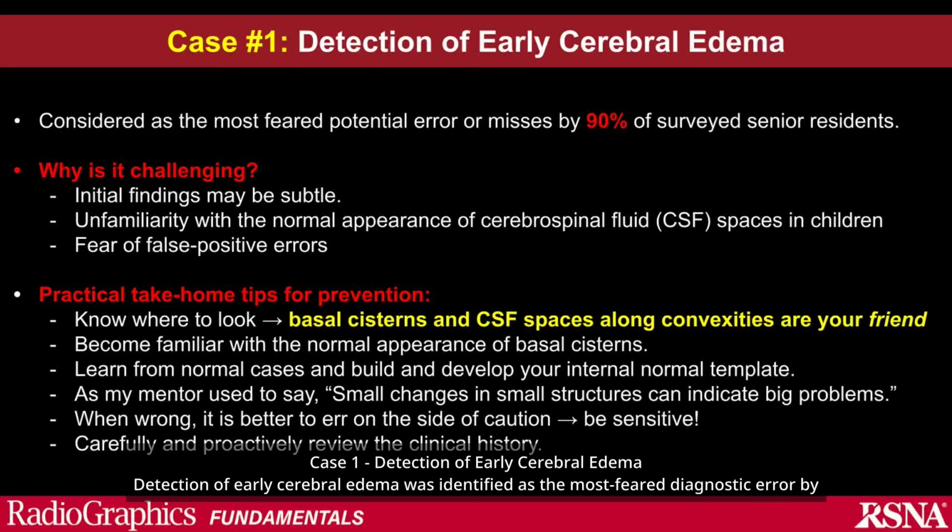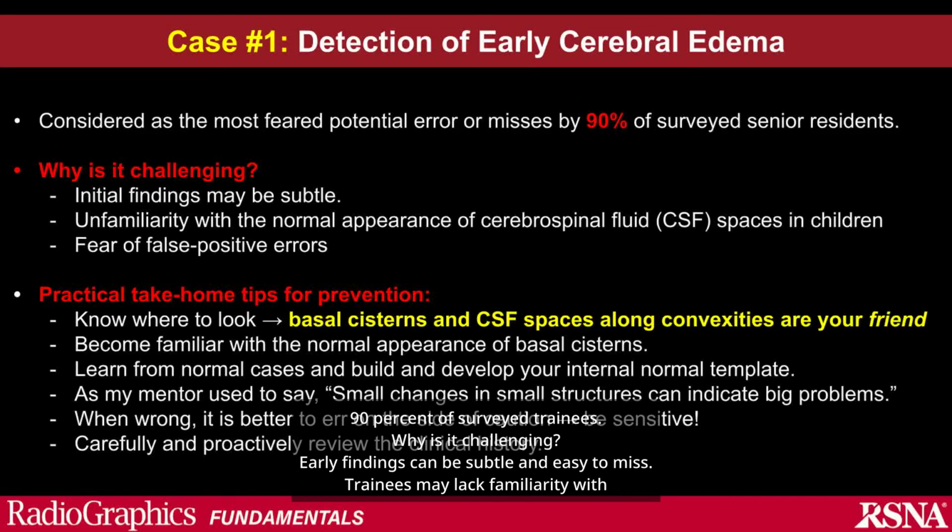Case 1: Detection of early cerebral edema. Detection of early cerebral edema was identified as the most feared diagnostic error by 90% of surveyed trainees. Why is it challenging? Early findings can be subtle and easy to miss. Trainees may lack familiarity with the normal appearance of cerebrospinal fluid spaces in children. There is a fear of overcalling findings and reporting false positives.